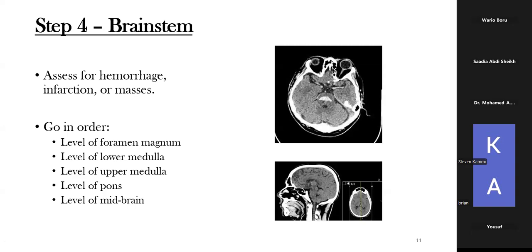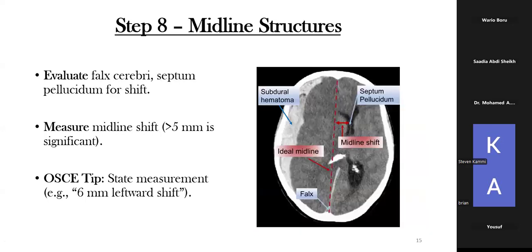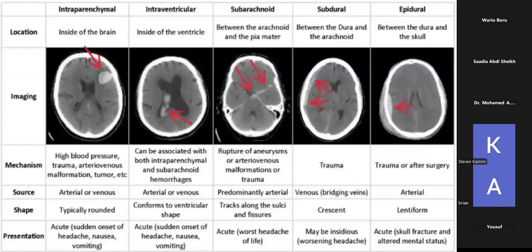Then within the intraparenchymal, kindly clarify the temporal and parietal lobes. So let's see, intraparenchymal bleed. Here it is quite hard to tell the temporal lobes because we're at the level of the lateral ventricles. So the temporal lobes would be much lower, probably at the level of the middle cranial fossa. So here, most likely this could be part of the central sulcus, probably. So that's the frontal lobe. It should be the parietal lobe. Then most likely this is where the notch is, but it's hard again to tell because there's effacement. If there's effacement, you cannot clearly tell the sulci and the gyri, but approximately around here, this is where the occipital lobe is going to be. So I hope I've answered.